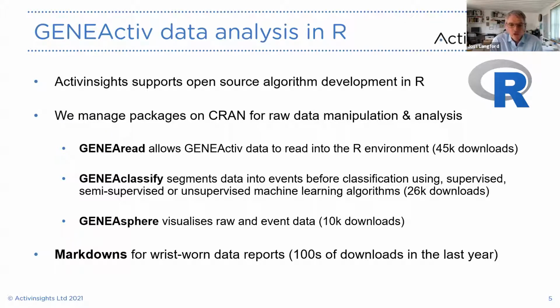GeneActiv, there are some tools in here for doing segmenting data and applying models to that data. And lastly is a GeneAsphere package, which allows the manipulation of data for some forms of visualization, and particularly around the sedentary sphere.